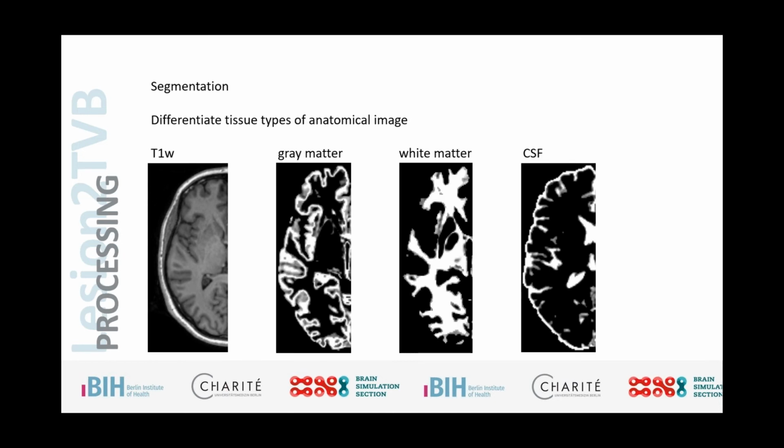Like I mentioned before, for the segmentation that we want to have, we're starting with the T1 image. Actually, we're doing this on a rather processed image, so we already have the skull stripped and the brain extracted, etc. And then we want to actually extract the different tissue types. Here, the most important are the cortical ribbon, the gray matter, the white matter representing the tracts, but also the cerebrospinal fluid really encapsulating the whole brain and filling those spots. There are different tissue types that can be computed.